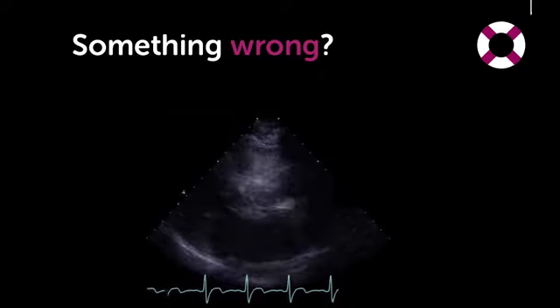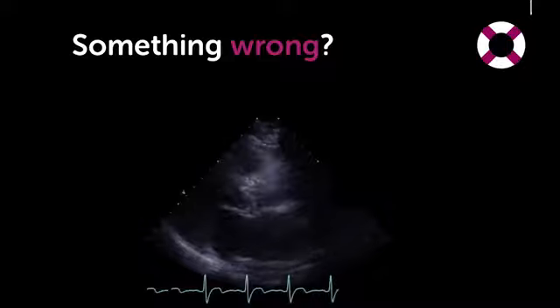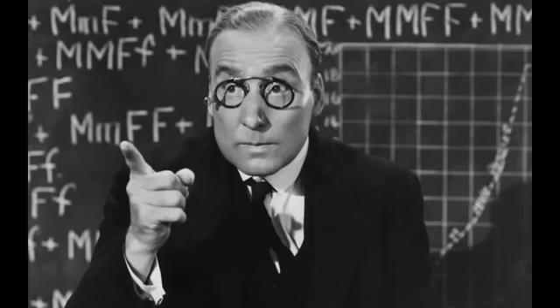The question will be, is something wrong with this echo or not? Is everything okay with the valves? Well, I'm not going to give you the answer right away. I want you to complete the lecture, and I'll tell you at the end. After all, I want to check if you're really in the classroom or not.